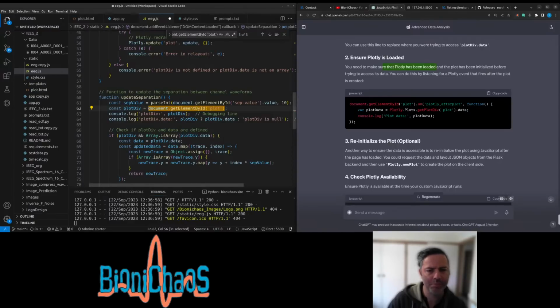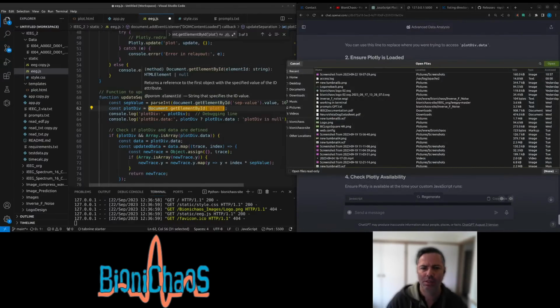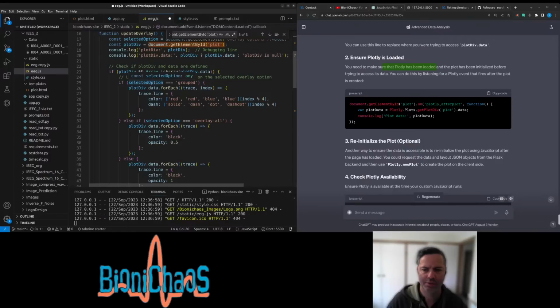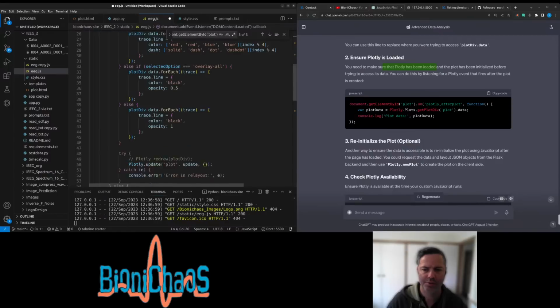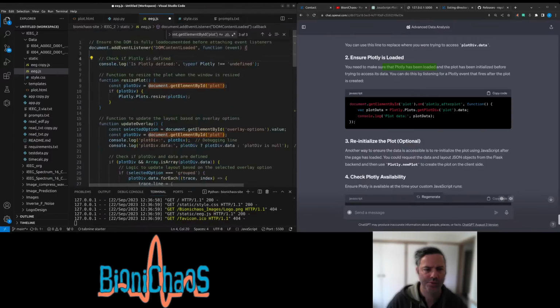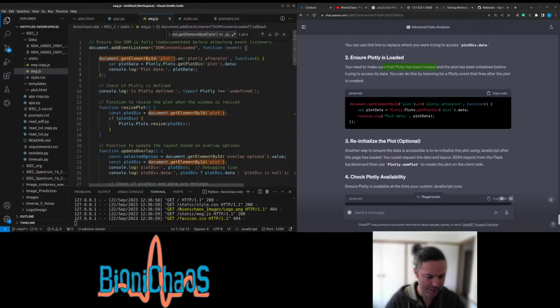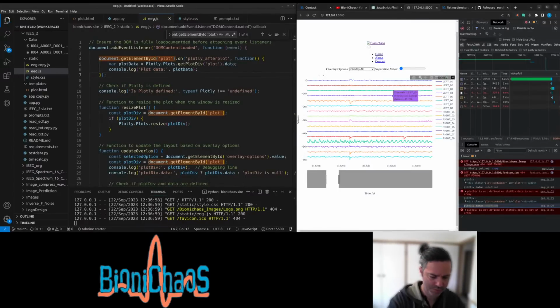Where do I place? Oh. Place it in the beginning like that, not sure.